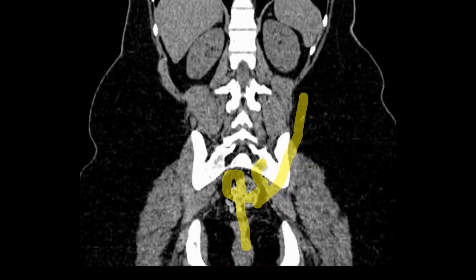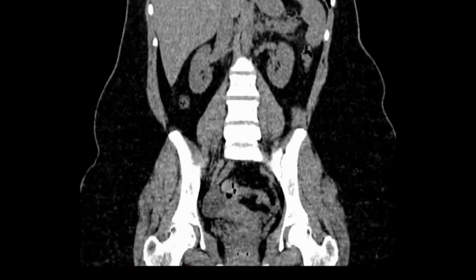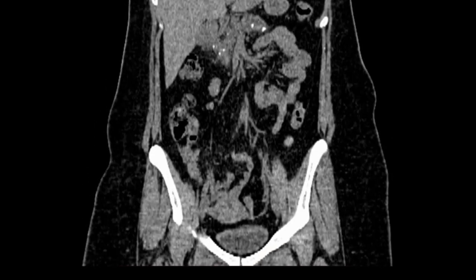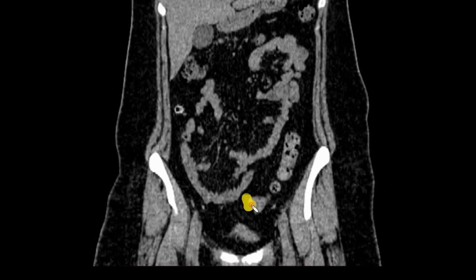There is looping of the intestine. It's turning, then it's turning on its own, and then it's going. Because the sigmoid is redundant, you may see different versions of the looping. But what you have to follow here is this loop, so that it connects to the descending colon.